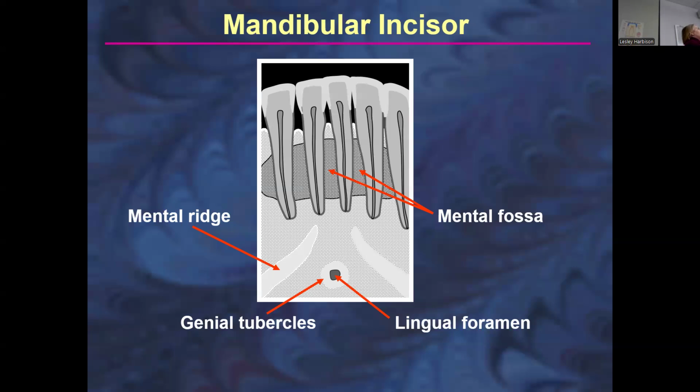You really have to pay attention to the question because an arrow could look like it's pointing to either one. So what's it pointing to? Is it asking about a radiolucency or a radiopacity? Because they're opposite. So just read your questions carefully when you take the landmark exam, because otherwise it looks kind of the same.